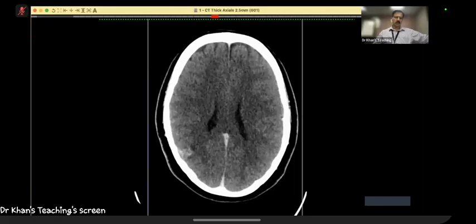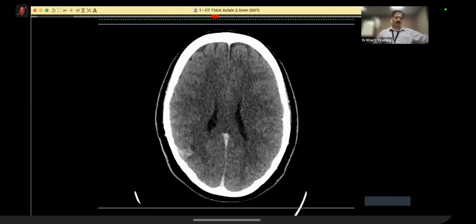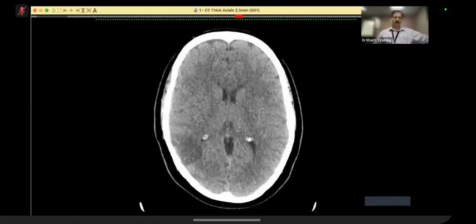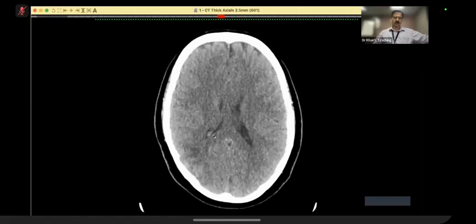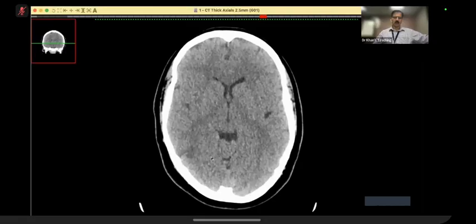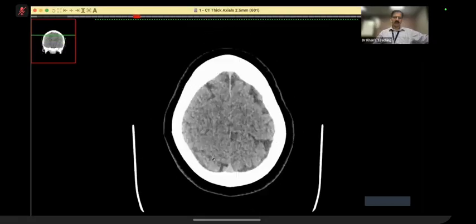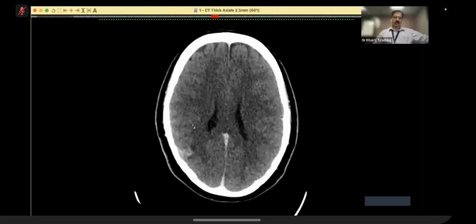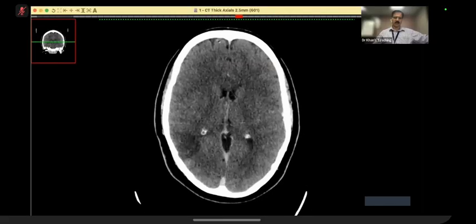now, this case was about 5-6 days old. There can be enhancement even in stroke after maybe 5 days. There can be leptomeningeal gyriform enhancement that will not change anything. This was the initial non-enhanced. And the key finding is that it does not correlate with any arterial territory. And then on post-contrast, there is a bit of gyriform enhancement, which is explainable.